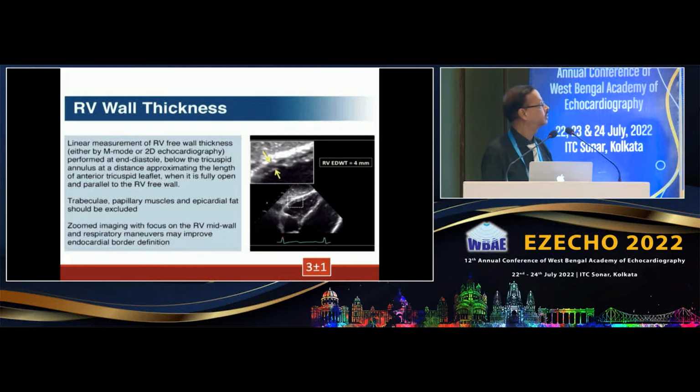Nitin, another important thing is to measure the RV wall thickness, to tell you the RV hypertrophy. A lot of things we have discussed about the LV hypertrophy, but clinically we can easily determine the RV hypertrophy by measuring the free wall thickness. Do you have any point about it?